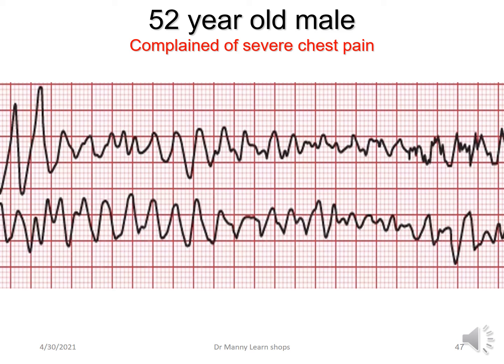A 52-year-old male complained of severe chest pain and suddenly he collapsed. With the emergency services department, they connected him to the monitor and they looked at this rhythm. He's unresponsive. This is coarse ventricular fibrillation. Code blue.